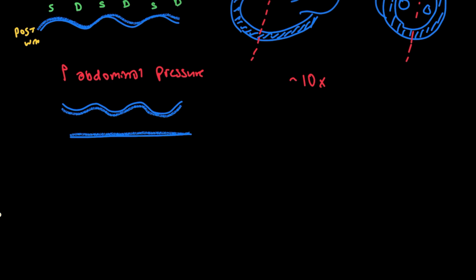Similarly, or conversely, what if you have right ventricular pressure overload? Increased RV pressure. You'll recall that in the parasternal short axis, you may see the D sign, where you've got your left ventricle, instead of being round like it should, this is your LV and your RV.